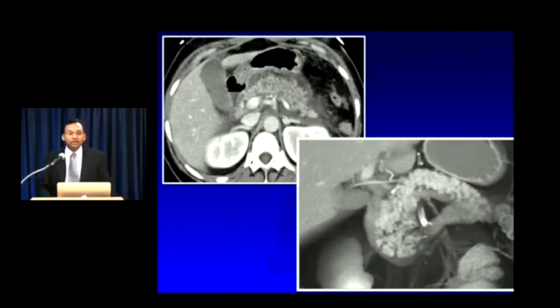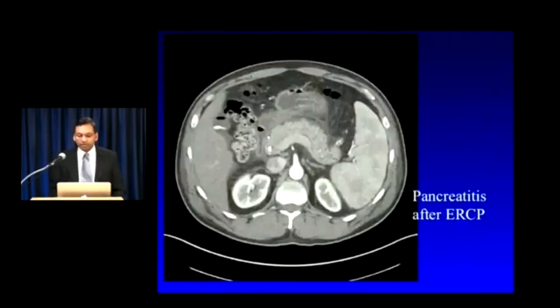Now here's a classic example of acute pancreatitis, right? You can see that the pancreas is enlarged, you're starting to lose some of those lobulations, and there's lots of peripancreatic free fluid and inflammation. Most importantly, you're going to track along and look at the entire pancreas, and you see that there's no areas of non-enhancement or severe hypoenhancement. So this is acute edematous interstitial pancreatitis.